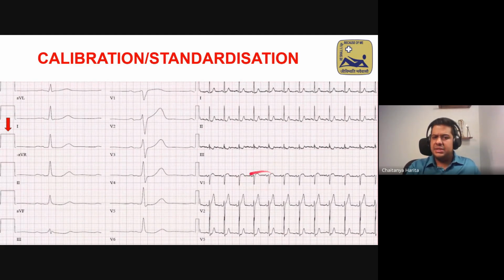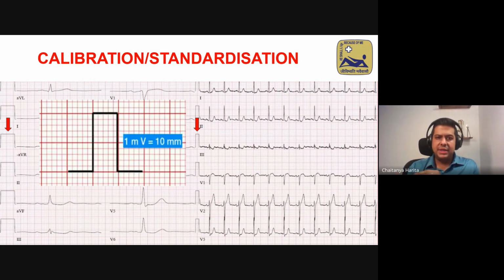On the opposite ECG on the right side, the calibration is too thin. The height is okay, but it is too thin. Because of that, the heart rate looks higher than it is, and the complexes are all narrow. So you will misinterpret based on this. Can you see how much of a difference the calibration makes? Please always check the calibration before you read an ECG.